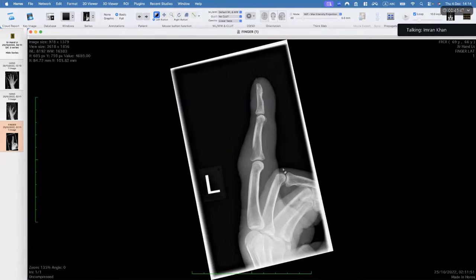There is no MRI available. This is the only imaging you've got. Tell me what are the differentials. Yes, sir. Given the age of the patient and the location, I cannot see any kind of differential densities or calcifications which are present. Primarily, it is a long-standing lesion along the dorsal aspect.